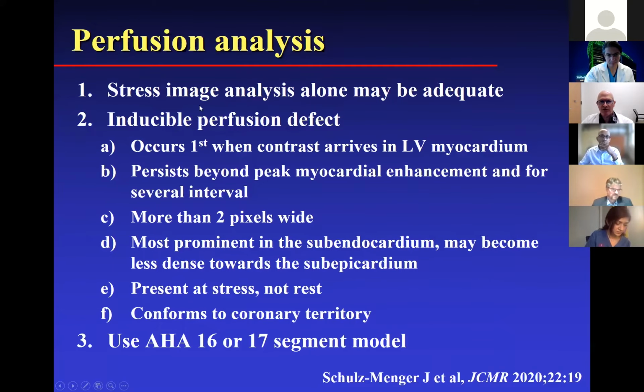So many labs look only at stress images and don't do rest images. I will say that our lab still continues to do rest imaging, because sometimes it can help delineate artifacts, but there are many labs who do stress imaging only, as well as late gadolinium enhancement.